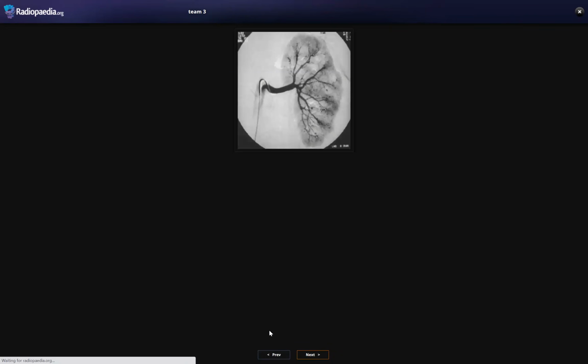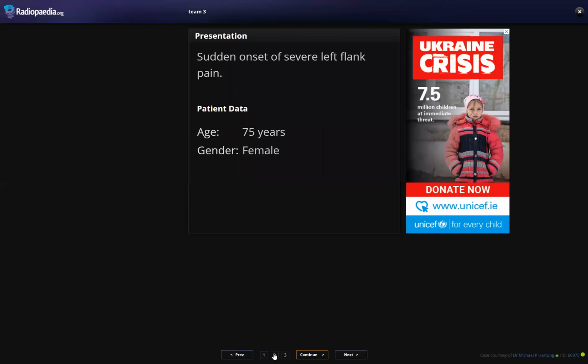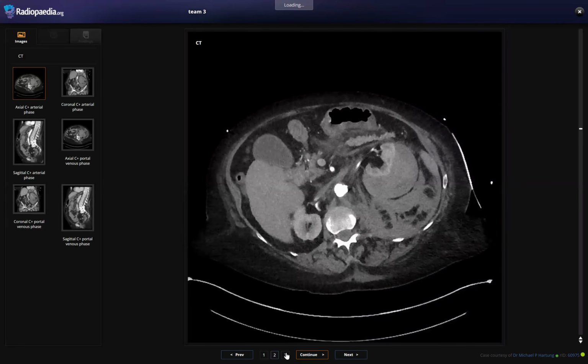Okay, perfect. This case might be given as a CT chest and abdomen, and we must remember vasculitis. It is a multisystemic disease, not only our mind thinking of sarcoid, TB, and lymphoma. Keep vasculitis in your differential diagnosis, because it can cause bilateral renal infarction. They can be seen as bilateral hypodensity in the kidneys and the spleen. And also they ask if the patient has hemoptysis with lung manifestation. So keep in mind vasculitis in your differential. And this one, just retroperitoneal hematoma, exactly as you mentioned, and active extravasation.